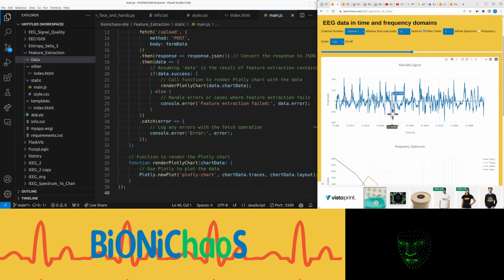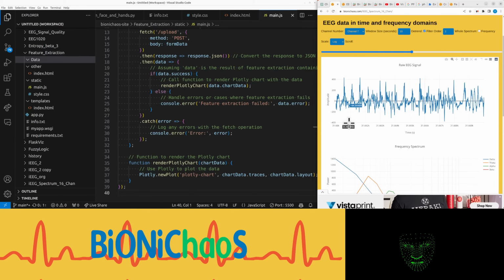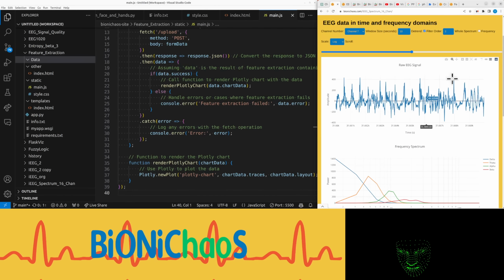This is an actual seizure. How about we do that as an image instead, and I can export image, download plot as PNG, done.